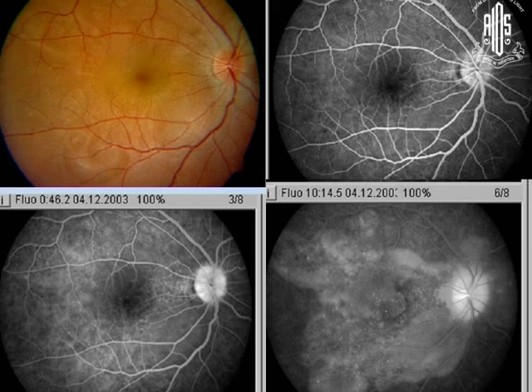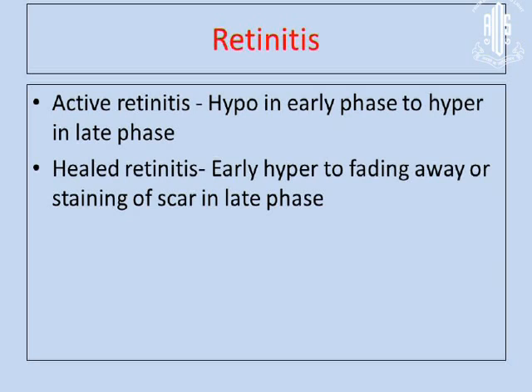These are nothing but the changes in the retina, changes in the RPE. Due to the chronic changes in the choroid, the overlying retina also starts showing changes. So the main features are hypo to hyper, but if you see these pinpoint RPE changes, they are known in VKH, so don't worry, they are not something else, they are uveitis only.